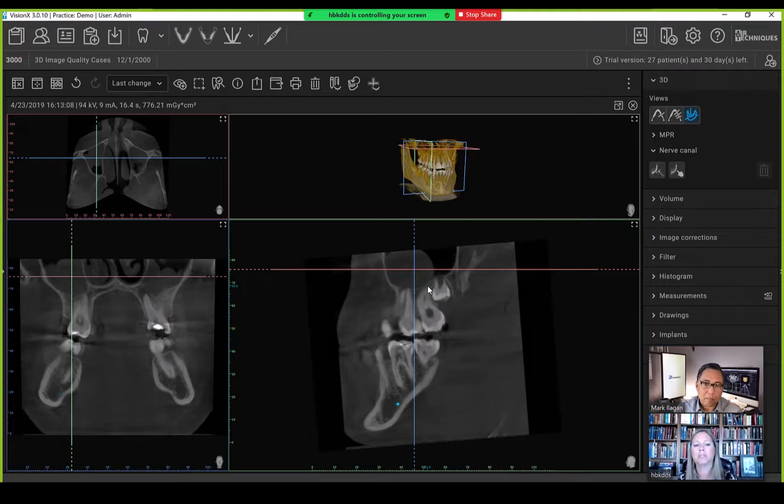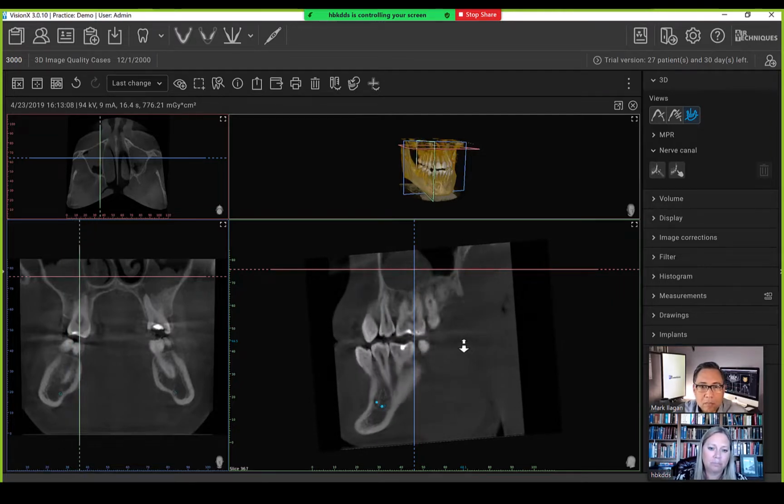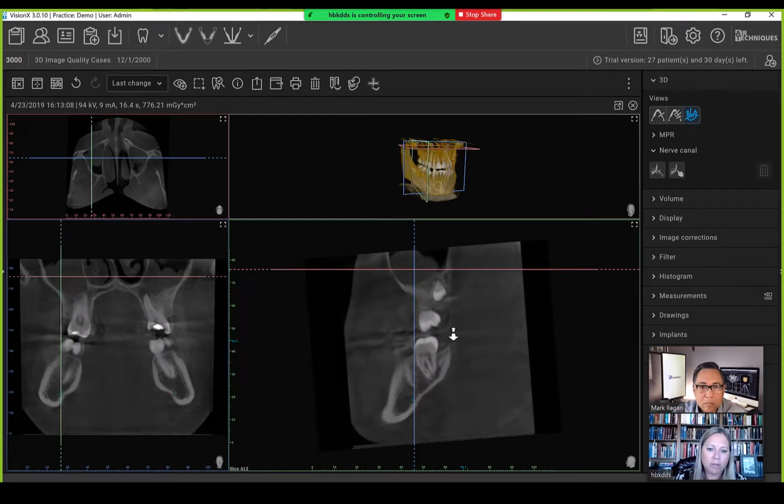So what I typically will say is that we have an acute or allergic rhinosinusitis in conjunction with an odontogenic source, because we can see that it's starting to kind of crawl up the sides of the sinus. If it's crawling up the sides of the sinus, most likely it's not just odontogenic in origin. They're kind of both. So that's what I would say for that.